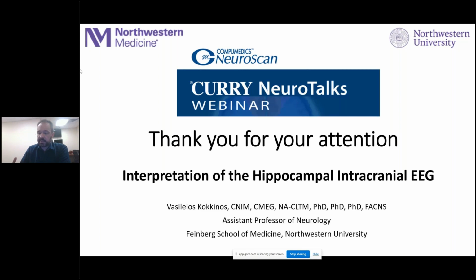The understanding that we have for the RNS recordings really comes from the stereo EEG, which is a 24-hour recording. We implant the patient with stereo EEG, we appreciate the entities and everything that we see in the hippocampus, and then when we place the RNS in the hippocampus, having seen what we've seen in the stereo EEG, we can interpret what's going on in the RNS recording.